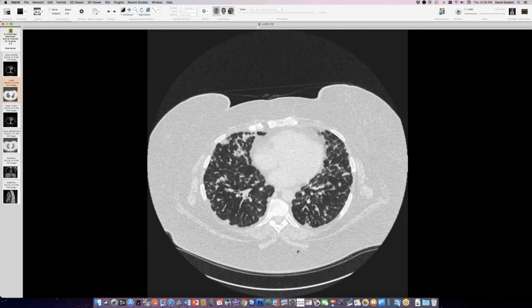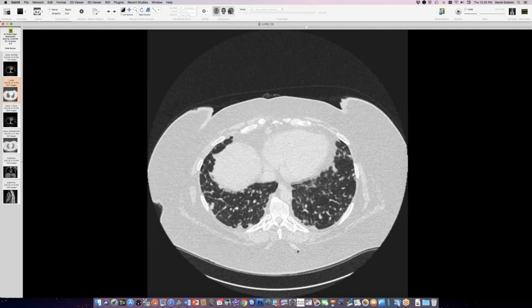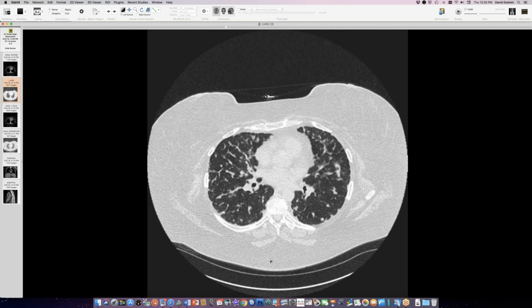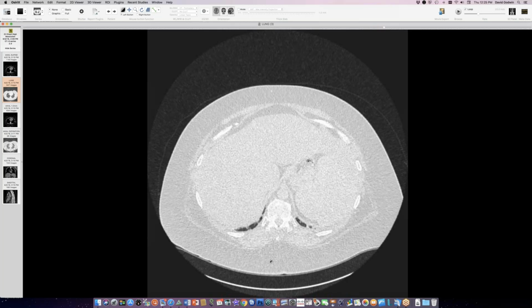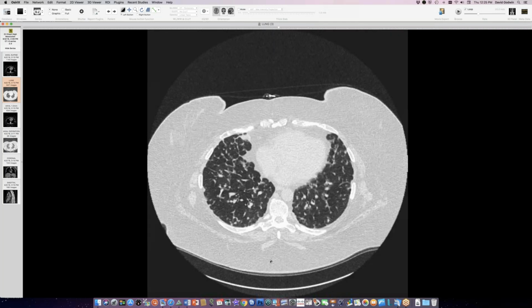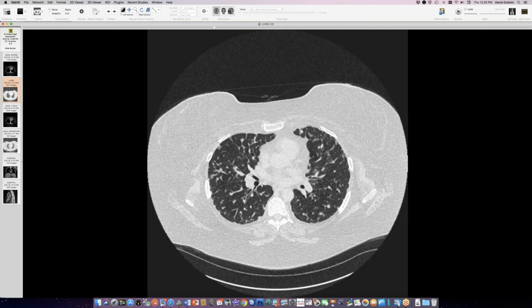And she never did have the airways disease that I thought might reflect her immune deficiency. So this is GLILD based on biopsy. And she has a nice big spleen too. Yeah, that's right. She does have a plump spleen, so I think it all hangs together. Yeah, that's a great case. That's a very good example of it.